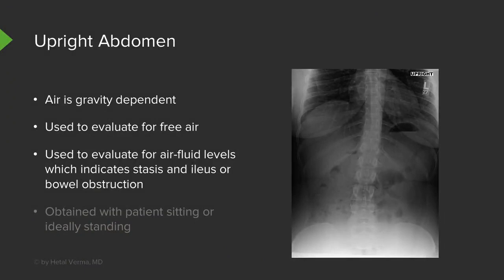So when the patient is standing upright, again, the air will rise to the top of the bowel, and you can see the air fluid level because the fluid will be at the bottom of the bowel. Usually these are obtained with the patient sitting or ideally in the standing position.